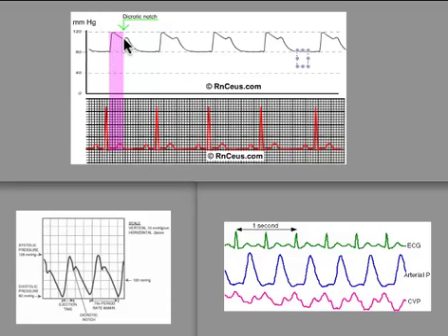And then sort of the tail end of this waveform is actually diastole. And so in diastole, it comes down to sort of your baseline or your zero line, which in our case is 80, and so this person's blood pressure as represented by this A-line waveform is 120 at the peak here over 80 in the baseline. And then with each heartbeat there will be a corresponding A-line tracing.